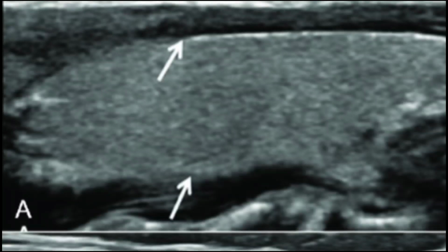Therefore pay attention to the echogenicity of the thyroid lobe, the thyroid nodule and also the thyroid strap muscles. Always compare one lobe with the other, look upward and within the parenchyma, and pay attention to whether there is some isoechoic or very hypoechoic nodule sitting within the lobe parenchyma.